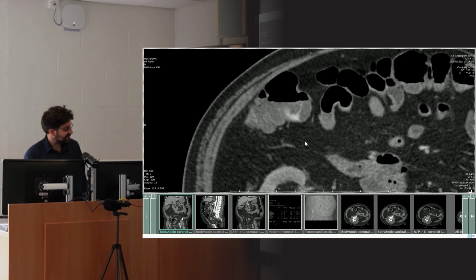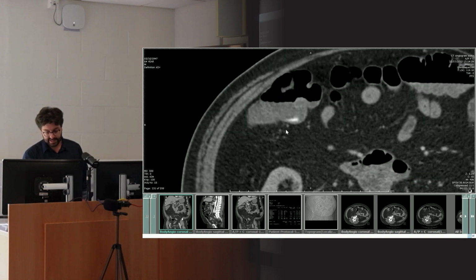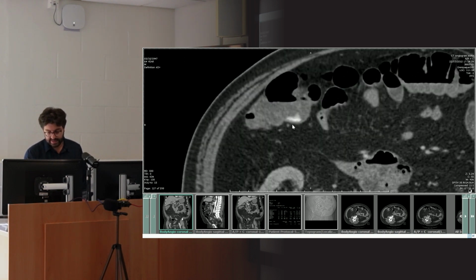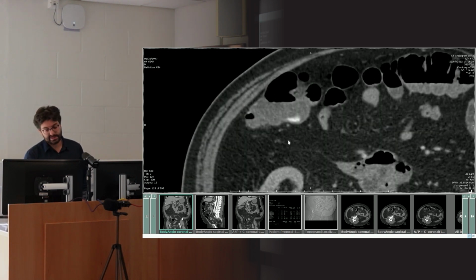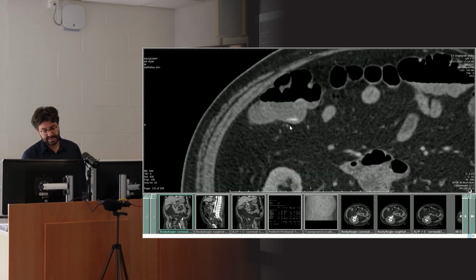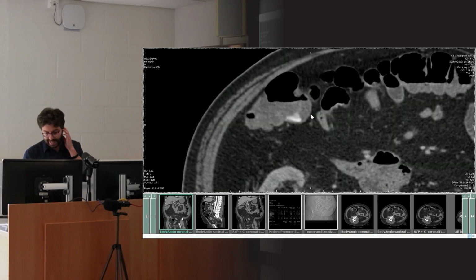Well, you might be thinking of things like diverticular disease. So you might look for diverticula. Can you see any outpouchings coming from the colon in this location? Well, not really. The colon looks fairly nice and smooth. Tumors. Can you see any irregular wall thickening of the colon in this area? Because tumors can bleed as well. Well, not really. Again, it looks fairly nice and smooth. So there's not really any obvious cause for this.